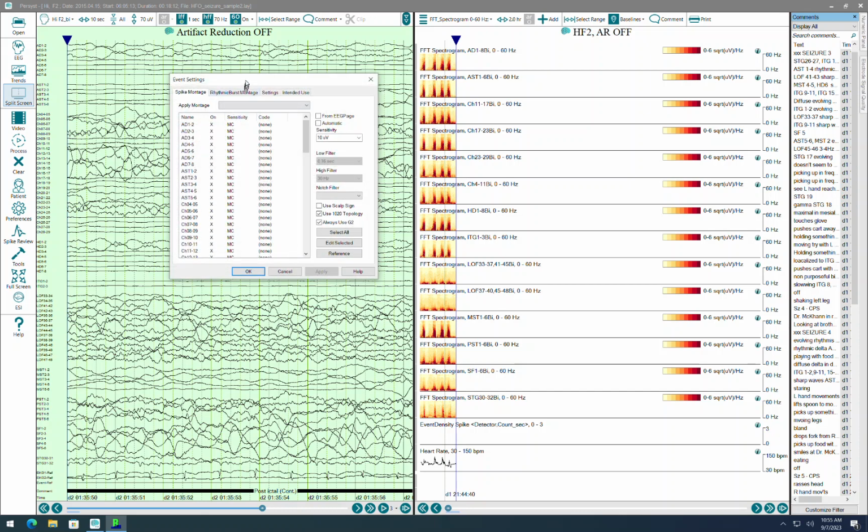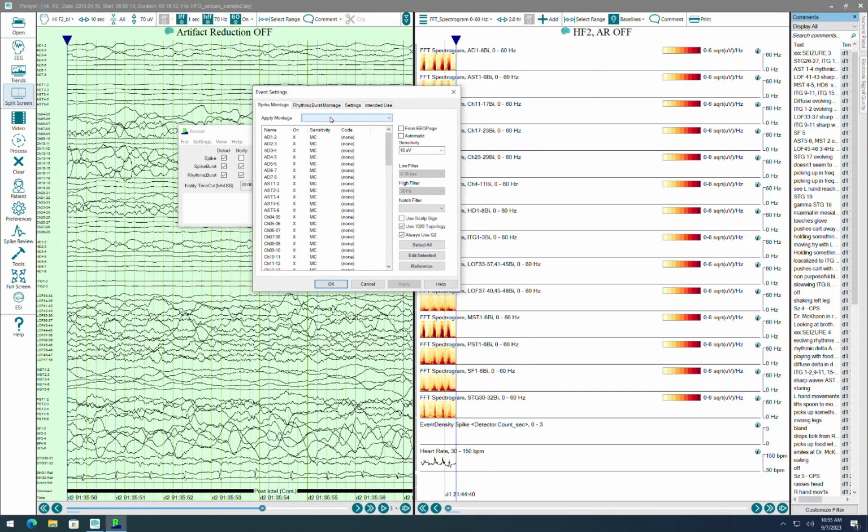do intracranial detection. So let's go ahead and apply the montage first, because right now it's just showing the recorded montage with all the inputs. And we'll pick a bipolar. You can pick a bipolar or referential in this case. So I've selected this. I'm going to change the sensitivity. If it was set to automatic, I want to remove that automatic designation and set it to what you're reading the EEG at. We're reading this at 70 microvolts. So we set it 70.